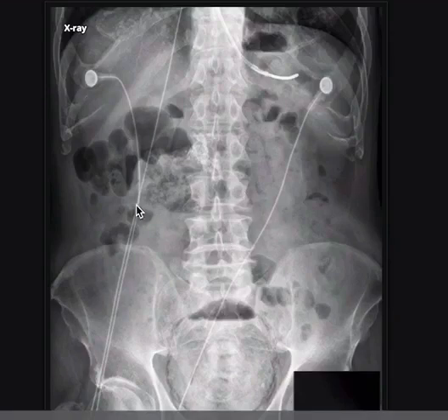So if the patient is unwell and has fever, especially if he is diabetic, these features are mostly suggestive of emphysematous cystitis. I would urgently contact the referring clinician and deliver the findings to him. I may arrange for CT for better clarification of the case.